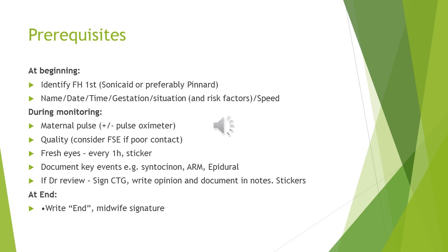Document any key events, like if you had oxytocin augmentation, if you had an epidural or amniotomy, because these key events will again add to the clinical picture of the patient. And once you see the CTG, please sign it, write your opinion, and document it in the notes. Again, it's a medico-legal document which requires proper documentation. And when the patient delivers, you need to make a straight line right at its end, and the midwife should sign it.